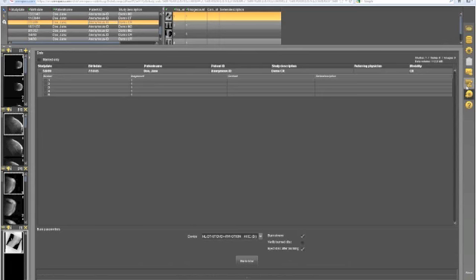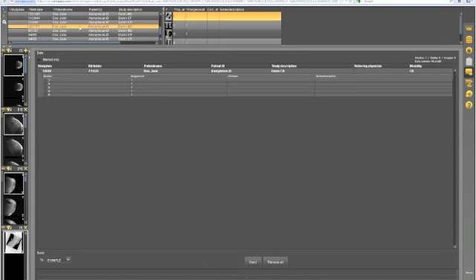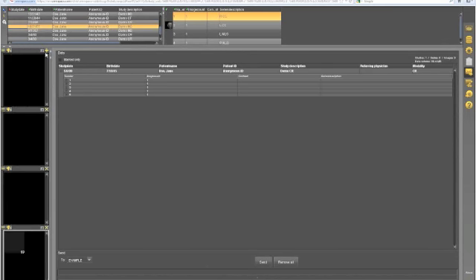The other thing you can do is actually do a DICOM send right here. So we select a destination. For example, I have an example here. Again, it's click and drag the study. You can send multiple studies, and you can push them over to whatever destination. This destination information is configurable by you. You can add as many as you like. There is no limit to it. However, the destination must be on the same network. For security reasons, you can't send over the open internet, so it must be accessible on the local network.